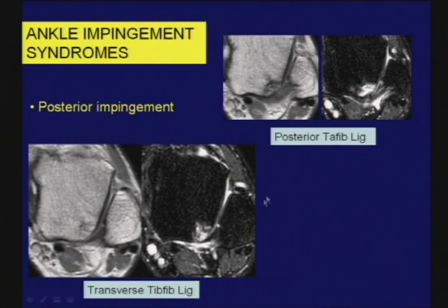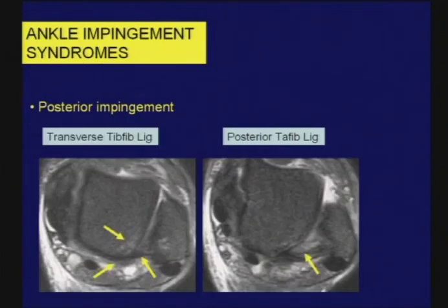This is the inferior transverse ligament, remember, one of the syndesmotic ligaments, and although not thickened, we were impressed that there was cystic change within the subjacent bone. And we also saw that that cystic change extended inferiorly adjacent to a thickened and irregular posterior talofibular ligament. So in a case like this, we would raise the possibility that this may indicate impingement.